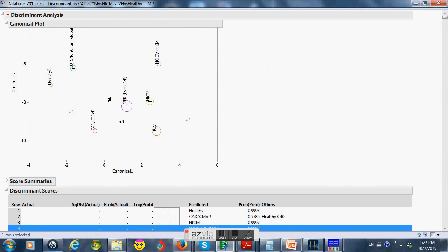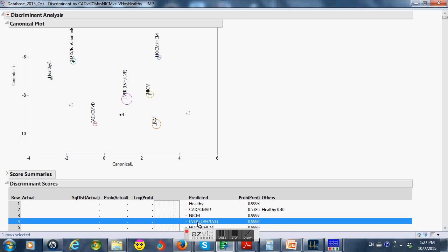Number 4, here, this was a guy with a normal ECG, but remember we had some hints of LVH by the 3-dimensional ECG, and he indeed is orbiting the left ventricular electrical modeling, LVH, LV enlargement sphere, and pretty firmly into that category in spite of his normal conventional 12-lead ECG.